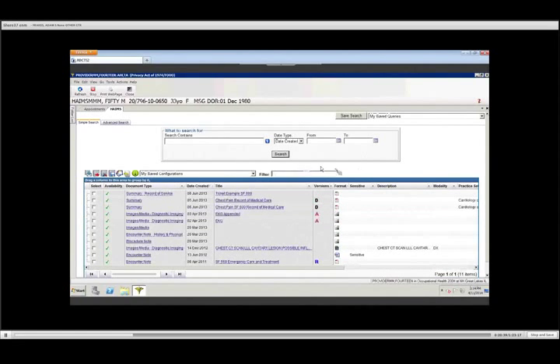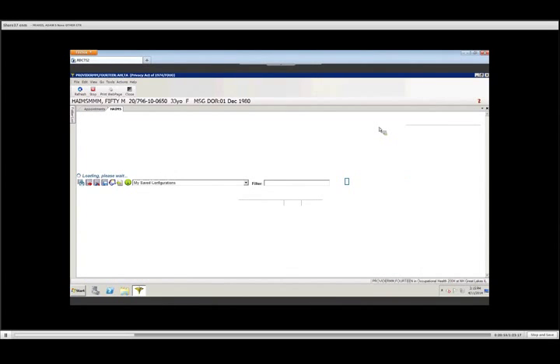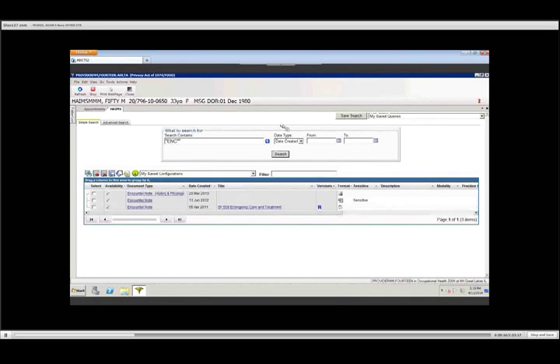I mentioned the saved search queries. If you'll notice under my drop down up here, I have a search query that is saved under the word encounter. If I click on that, it will automatically search for any keyword that has encounter in it. Again, you'll notice what it did.